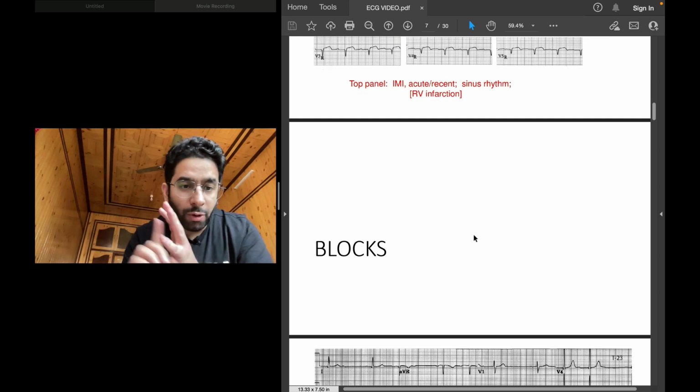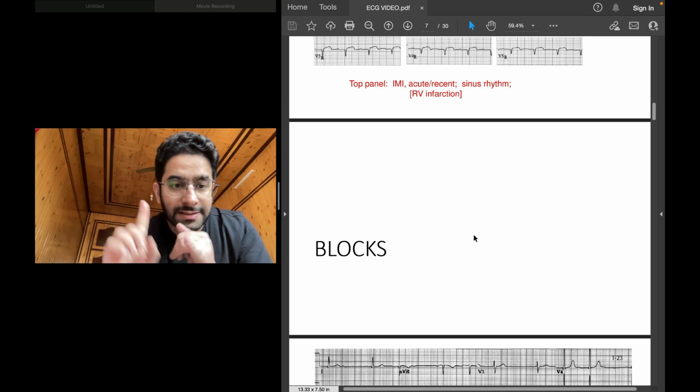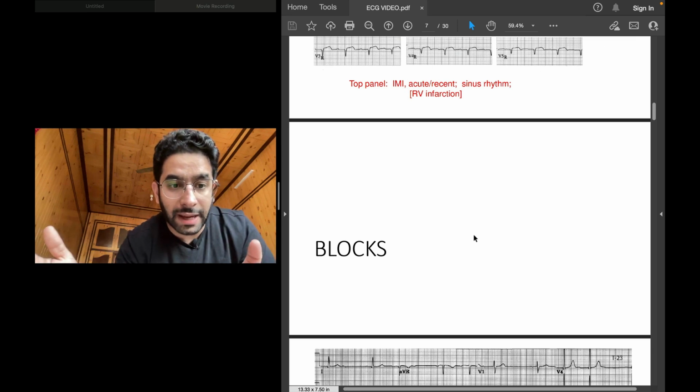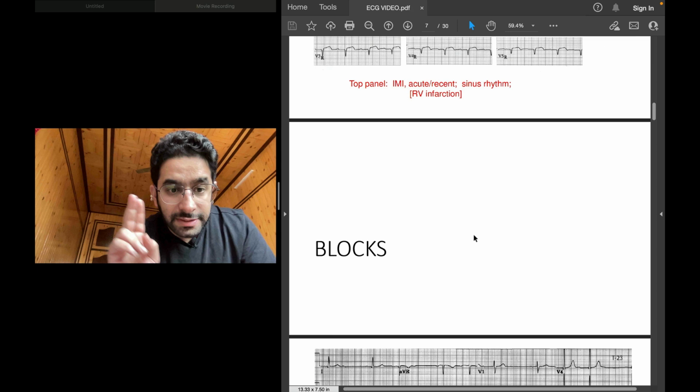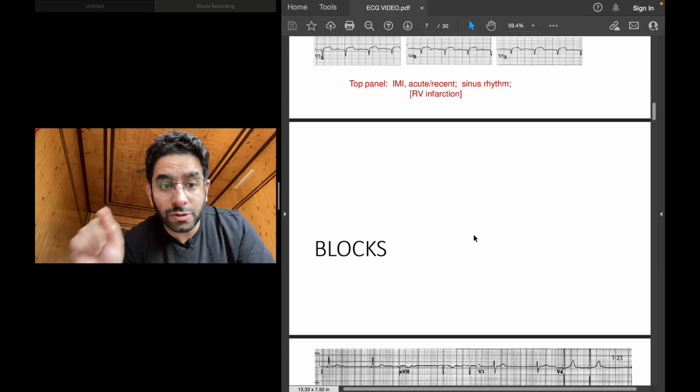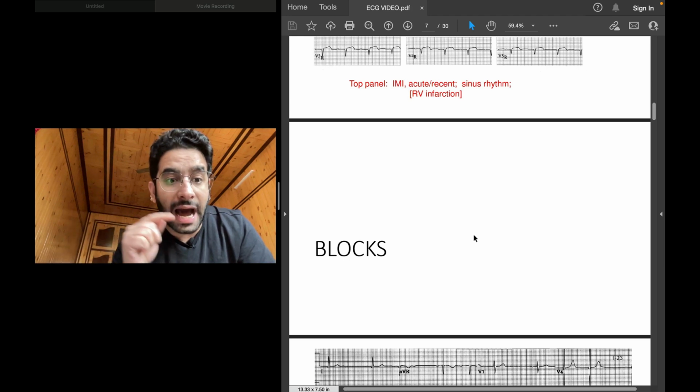Okay. So more likely you will be faced with such ECGs. You'll appreciate ST elevation in anterior leads. There will be reciprocal depressions in inferior leads. You'll label this as anterior wall MI. Culprit vessel is LAD more likely. And you'll appreciate ST elevations in inferior leads, 2, 3 and AVF, you label this inferior wall MI. And if right-sided precordial leads also show elevation, that's more likely in RCA MI.